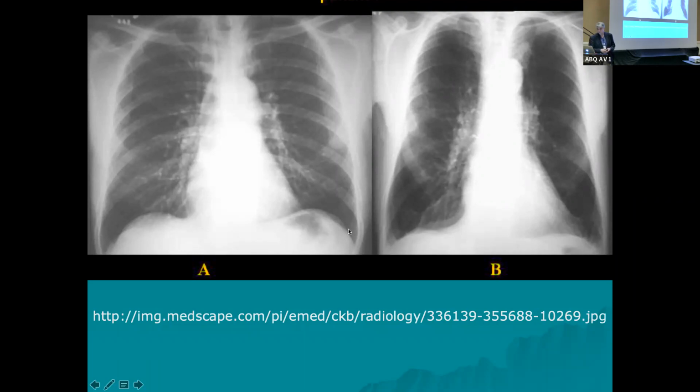Look at the diaphragms, that's another clue. Look at how peaked that is right here. You can see the sulcus right here, a clear sulcus right through here. I look at the diaphragm here, it's clear, but it's flat. I also look at the lungs right here. I can see good tissues throughout the lungs. This looks darker, like there's more air trapped in this one. Diagnostics, any thoughts?